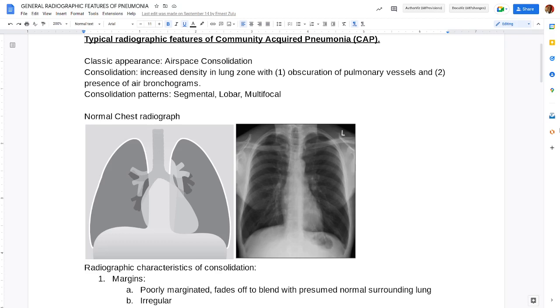And then the vertebral column in the middle there, the spine, those are bones. Depending on how dense the material the X-rays are passing through, they'll produce a characteristic shade of gray on the film. If that material is very hard, like bones, it will look white.